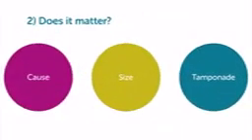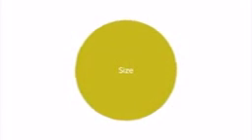Now we'll go to a second important point, namely, how large is the pericardial effusion? You probably noticed from the examples I showed you so far that there is a fairly large variation in the size of pericardial effusions. Well, normally you have at least some degree of fluid within the pericardial sac. That's important so that both parts of the pericardium can glide between each other, but the fluid never exceeds maybe 15 to 20 milliliters.